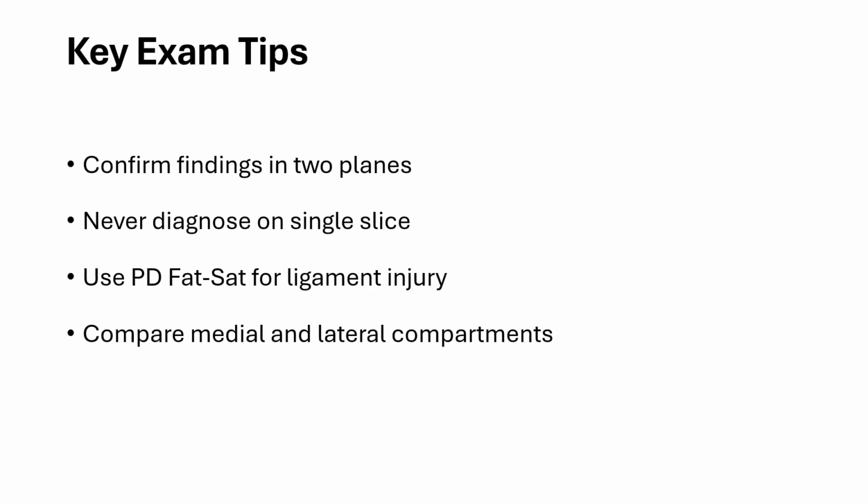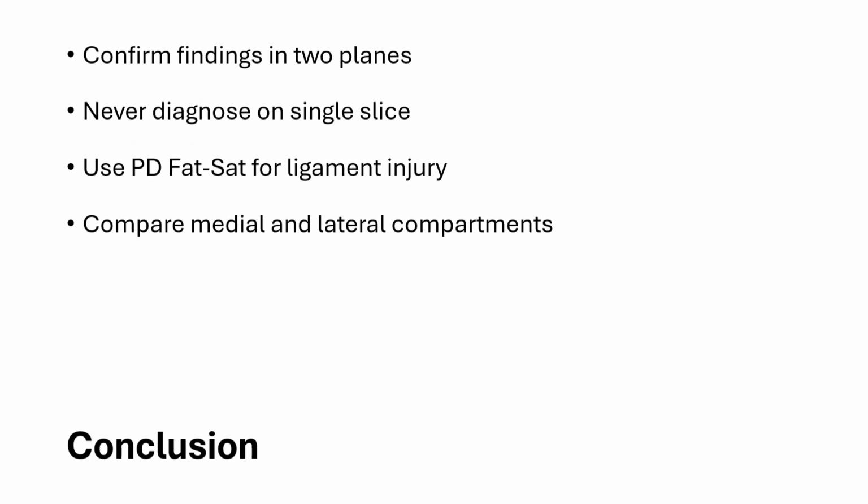Key exam tips are: confirm findings in two planes, never diagnose on a single slice, use proton density images with fat suppression or STIR for ligament injury, and compare the medial and lateral compartments.